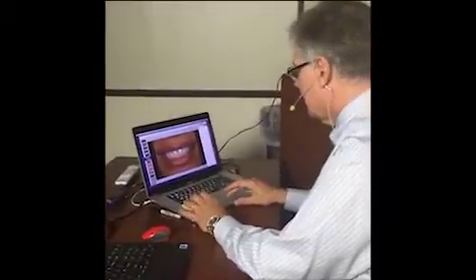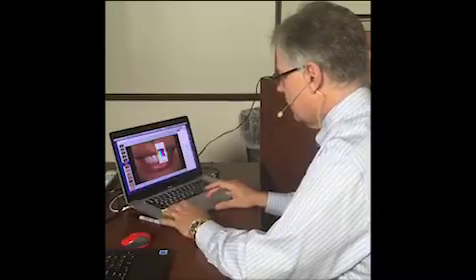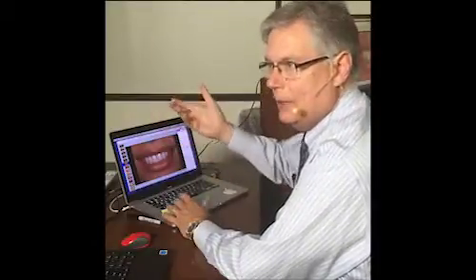You get the idea? Once it's done, if you click off of it, okay, if I double click, I can now go in and select it, and then I could pick what color I wanted it to be. If I hit Style, it'll let me pick a color over here, so I can make it yellow. If I wanted to do that, I could draw along the occlusal plane, which I'll show you in a little bit, and then I could move that line up and down.